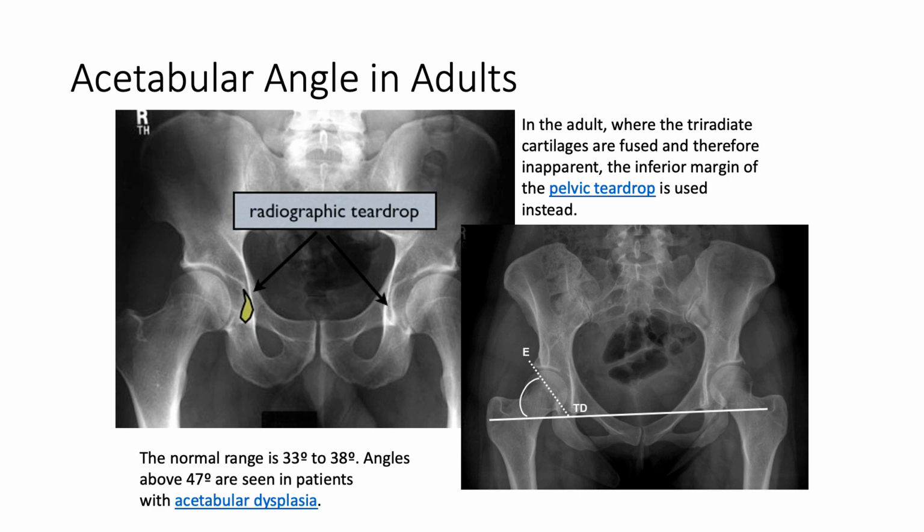You might wonder why acetabular dysplasia in adults. Well, probably these adults had dysplasia when they were younger, and they had neglected it. So you might still see it in adulthood. More commonly in adults, the acetabular angle is useful if you have high index of suspicion for trauma of a particular side of the hip, where you can't decide if the hip is subluxated or dislocated.